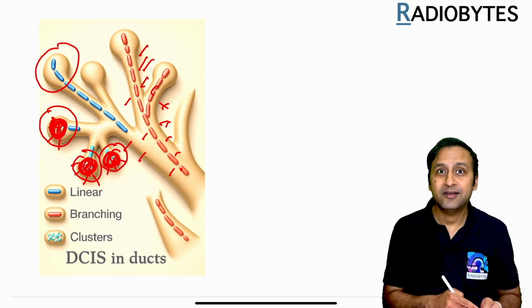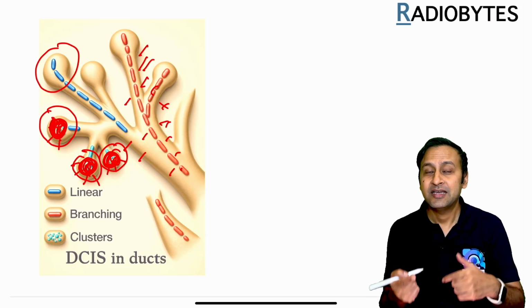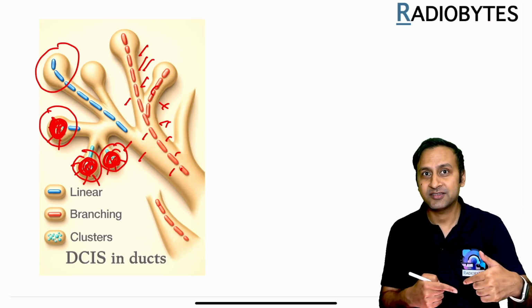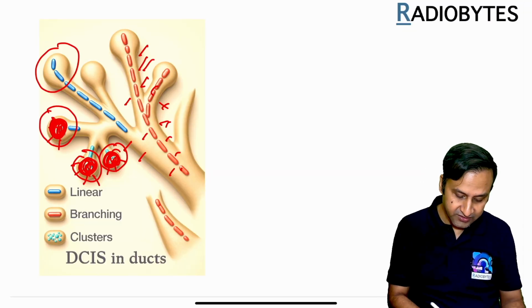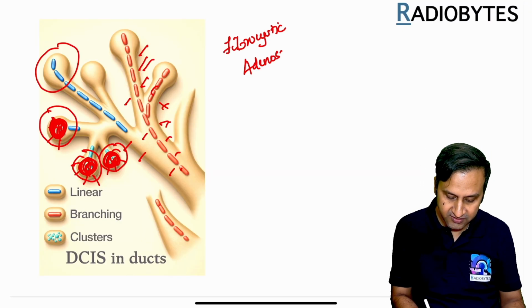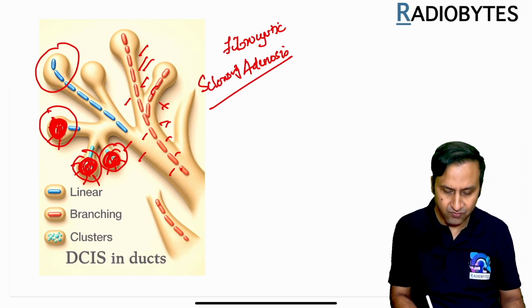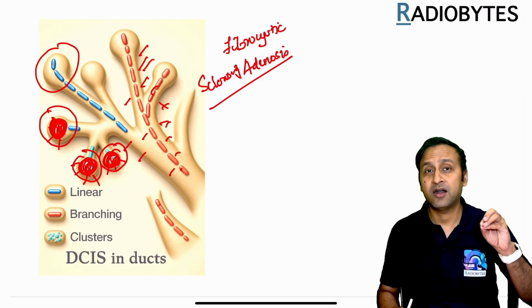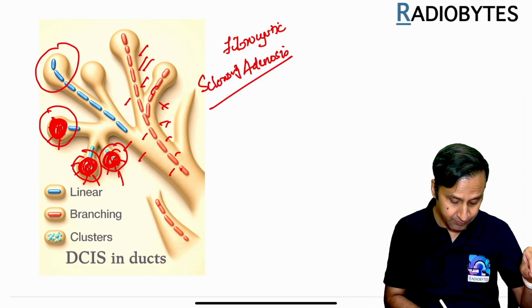And we have already learned that it is basically the malignancy which results in sequestration of the dead cells in the form of calcium in the ductal channels. On the other hand, there are diseases which are more benign, like fibrocystic disease and sclerosing adenosis. These are benign, widespread diseases which affect a large part of the breast parenchyma. They are affecting predominantly this part. Why?